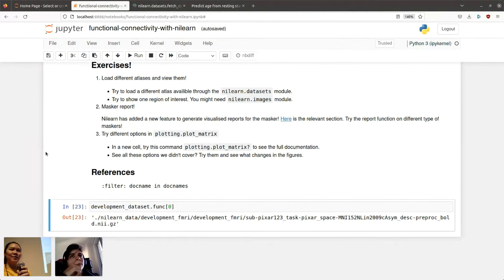And in Nilearn, when we're applying a functional atlas, you take the atlas and apply it onto your data, extracting signal from those regions. The follow-up question is, is it applied spatially? And the answer is yes.